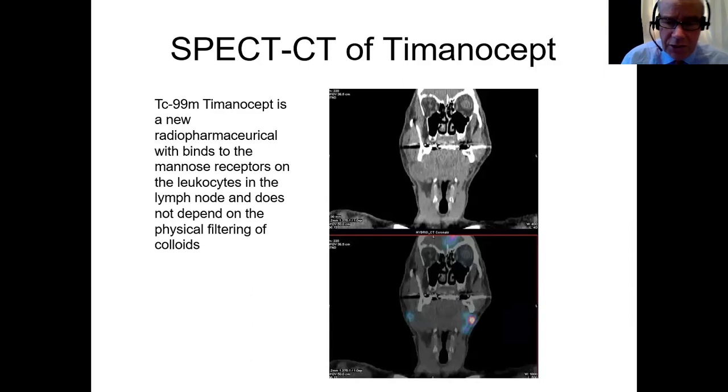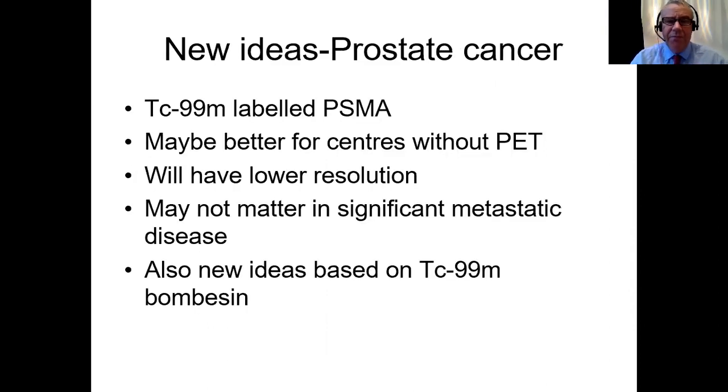This is one of our patients with tilmanocept. This patient actually had a melanoma here on the forehead. And you can see that's the CT. If you look at the SPECT-CT, that's what the primary injection is. And there are sentinel nodes bilaterally, again, anterior cervical nodes. So both of them are level 3 nodes. But this kind of information is absolutely essential to help the surgeon to remove all the sentinel nodes they can.